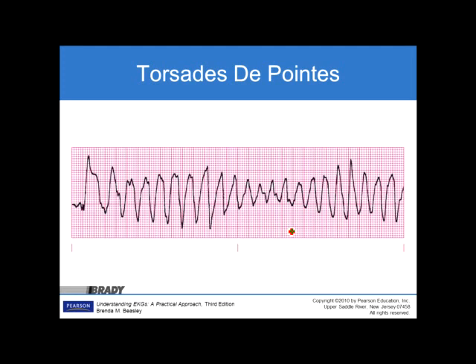How we identify torsades is by its variability, and it has a wave-like fashion that continues again and again. It looks like shark teeth when inspecting it, and it's wide and bizarre. Any wave-like fashion that continues to do this again and again should be considered to have some polymorphic tendency if the actual rhythm is wide and bizarre. Torsades de Pointes is identified by its wave-like motion, looking like shark teeth, wide and bizarre, with a polymorphic tendency.